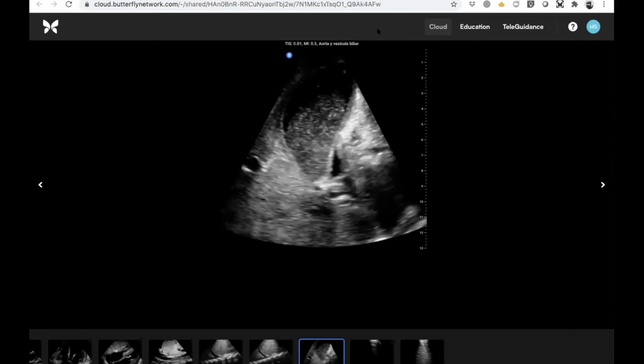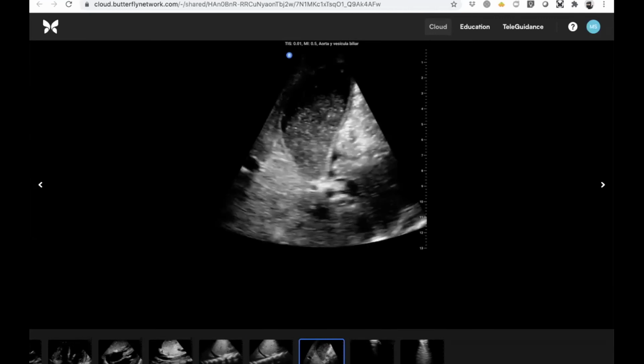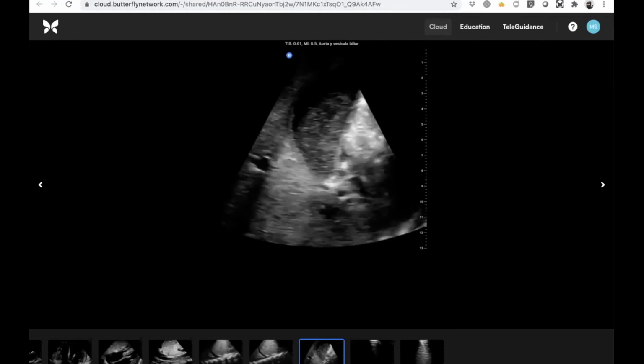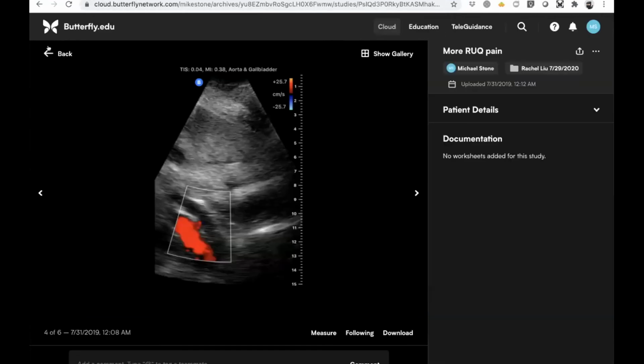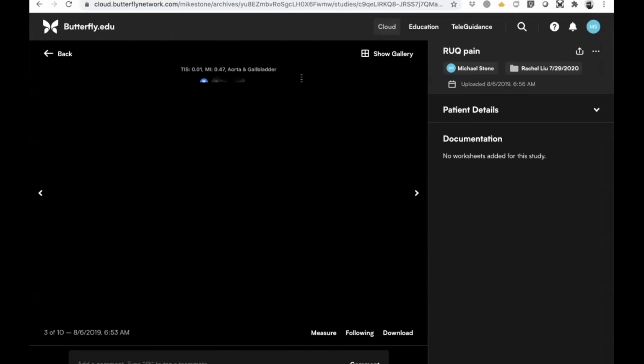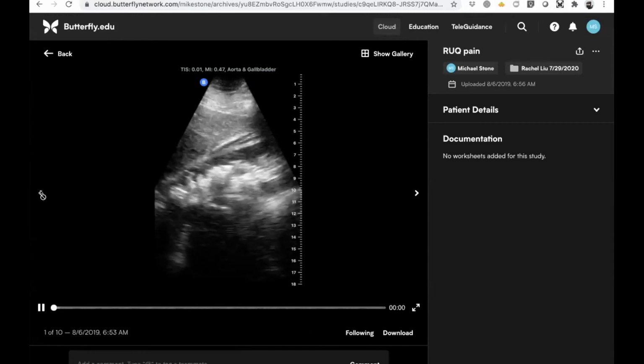I think we've got about 10, 15 minutes left, so we probably have time to look at a couple of other images, which I'll pull here. And just a good contrast image. We don't need to spend a lot of time on this one because I don't want to beat the gallbladder to death. But here's a long view of a gallbladder. We'll look at one that has a clip first so you can get some context.